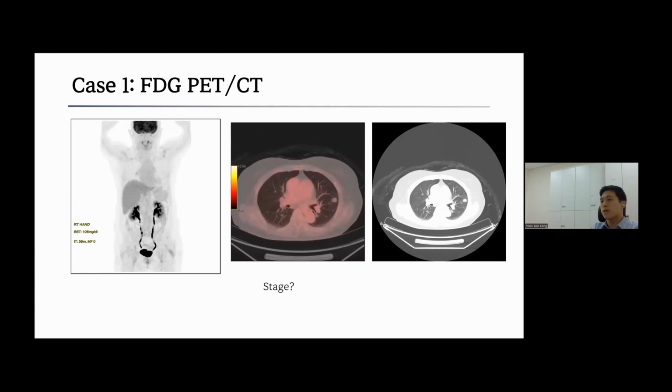These are FDG-PET images of this patient. And what do you think the stage is?